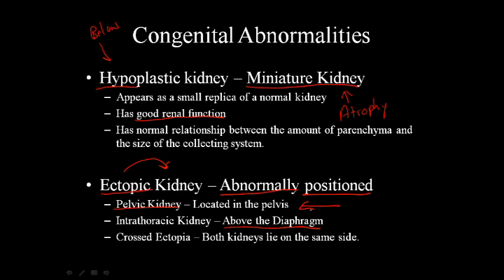It's pretty wild. When you see a person that has a kidney, as you're going down into the pelvis, you pass the crest, and all of a sudden there is a kidney. And the ureter is very short. This patient that I saw this pelvic kidney on, she had a history of renal stones, and they were often on the side that she had the pelvic kidney on, and she was having tremendous problems actually passing the stone. Required surgery several times.